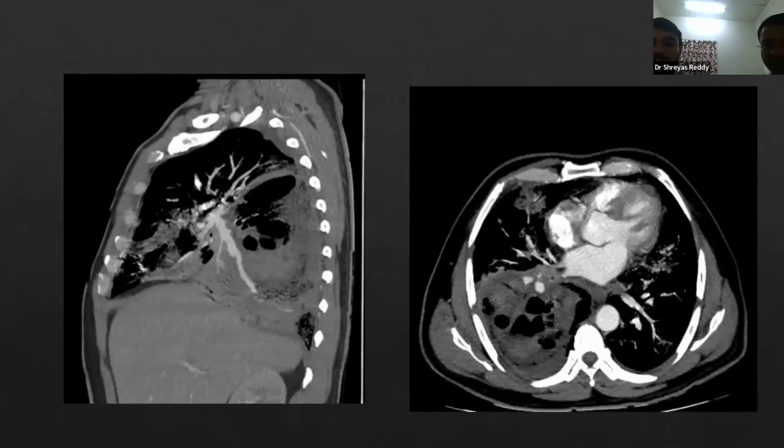Okay. So the aim is to take out the diseased lung with a course of antibiotics. And unfortunately, this patient was not fit for the lobectomy. So what would you do next? We would go and embolize this particular vessel, so endovascular treatment is one of the options. So how do you treat this patient? So I'll not go into too many details.